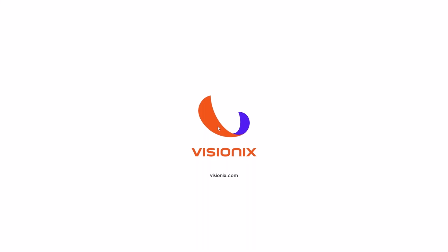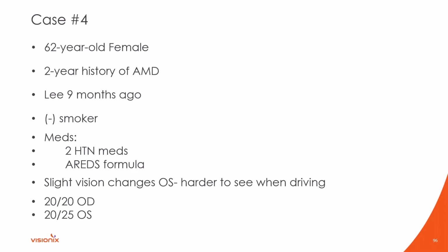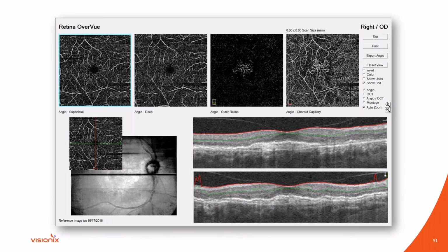And question, just to review, what were you looking for again that would indicate a CNVM in the OCTA? So I think you mentioned that early on. Can I go back to show some? Yep. So what am I looking for to look for a CNVM? Again, I am looking for the presence. I'm looking for something like this.